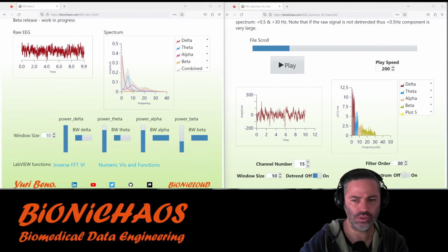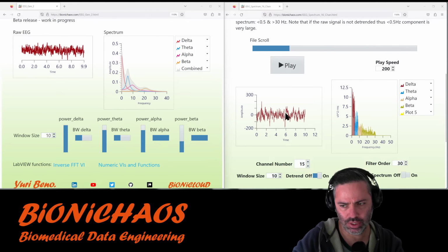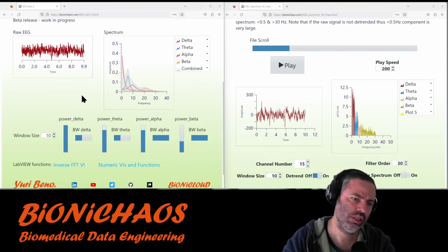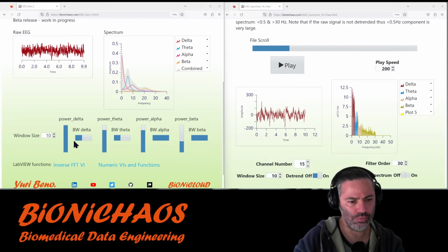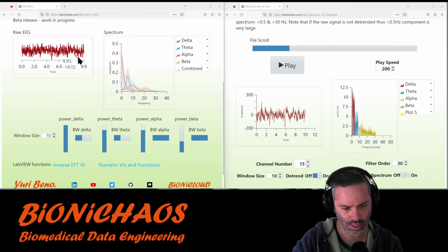So does it look the same? Well, not really. First, there's some sort of rendering issues. The line is just thicker there, so you can't really see. And yes, potentially this one has some spikes in it. The spikes would be in the lower component. And yes, this model is literally just taking white noise, band passing it into a certain frequency range, and then putting it together.